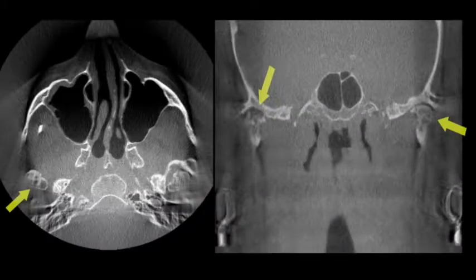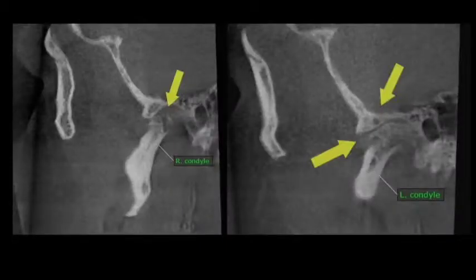And when I saw the condyles, I picked up the phone, as I do when I see something unique, interesting, or impressive. I pick up the phone and say, "Does your patient have diabetes? Is your patient on any of these bisphosphonates? Well, look at these condyles." Okay, I put, oh, that's for ankylosing. You don't have to worry about that. These were her condyles. Look at that right condylar head. It's almost totally dissolved. The left has big subchondral cyst formation. I can't even say anything about the joint space. By the way, the scanner is not a good scanner. So when they phone me to talk to me about it, they'll get my opinion.